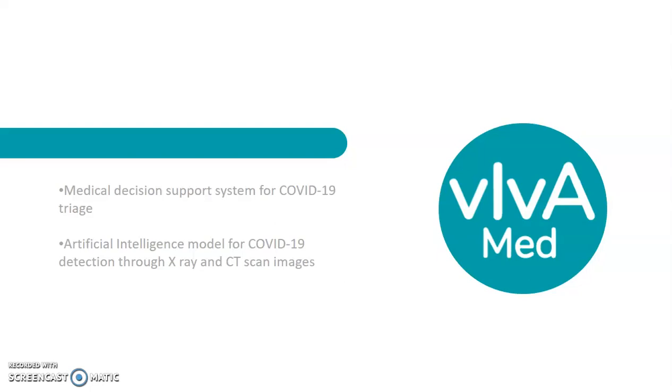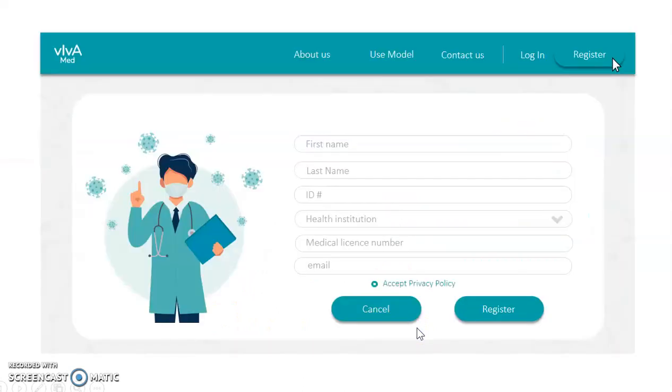Next, we are going to show how to use the vIvA-Med application for premium advanced use for health establishments at an international level.